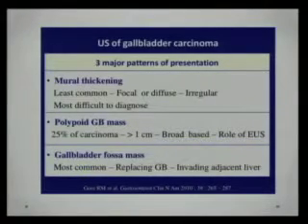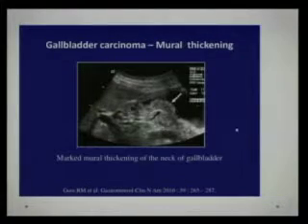And of course, role of endoscopic ultrasound is also just to identify what are the echogenic foci seen in that mass, more the echogenic foci, more the benignity. Coming to a gallbladder fossa mass, which is the most common appearance, and remember, this comes as one of the causes of non-visualization of the gallbladder. So non-visualization of the gallbladder, when the gallbladder has not been removed, could be several things. Number one, that it could be gallbladder carcinoma and the mass is replacing the entire gallbladder fossa and invading the adjacent liver, and you don't know where the mass begins and the liver stops.